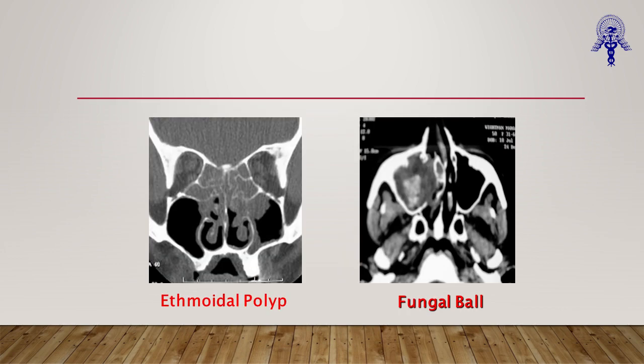Extensive ethmoidal disease, single sinus involved, hyperdensity, heterogeneous opacity, little widening of the osteomeatal complex, you should suspect a fungal ball. By definition, as you know, one sinus is involved and that hyperdensity shows fungal ball.